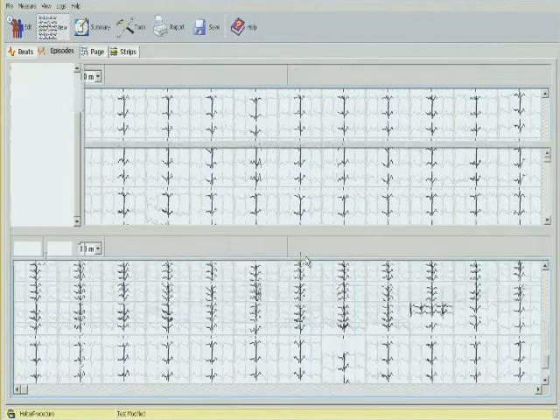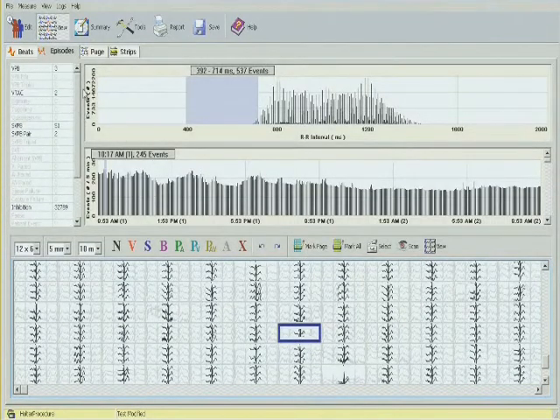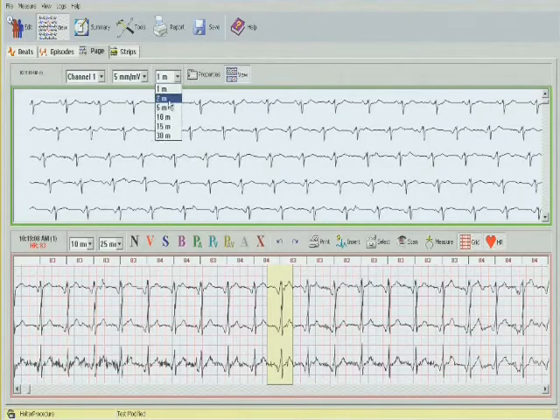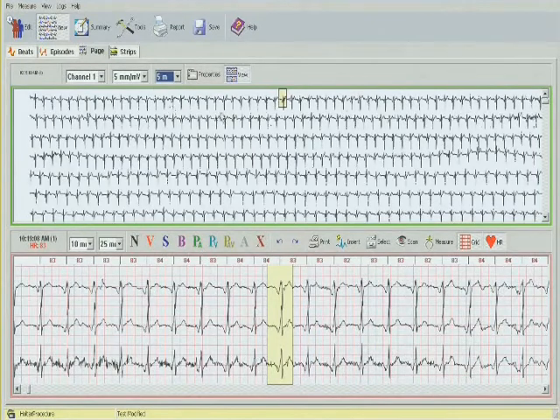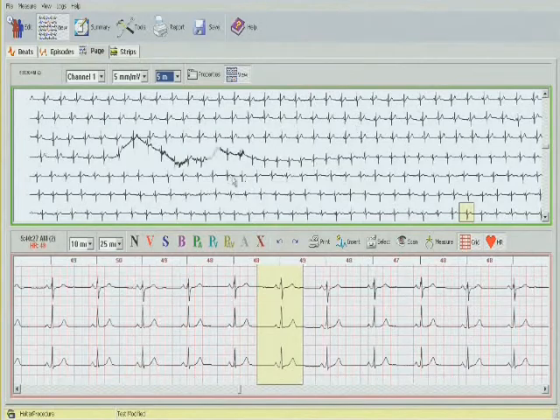So again, Z button to go out, and at this point we're pretty much finished with our editing. 3 ventricular beats, 2 runs of VTAC, 51 supraventricular beats, 2 atrial couplets. If there are any symptoms which you would want to correlate with the ECG, you could do this from the page mode. You can change the speed or the time interval, rather, 2 minutes, 5 minutes, and you can just pick the time which is indicated and see what's going on in the ECG.